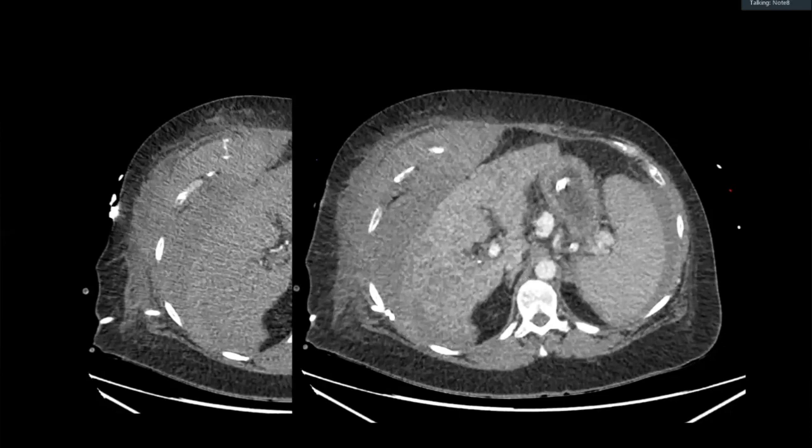I'm pertinent with the history of the radiofrequency ablation and the insertion of the needle. There is a linear hyper attenuating focus, which was in the arterial phase, and it has changed its shape, and it has become denser than the aorta in the venous phase. I can appreciate the difference between the density of this high attenuation area in the abdominal wall and the aorta. So, what do you think this is?